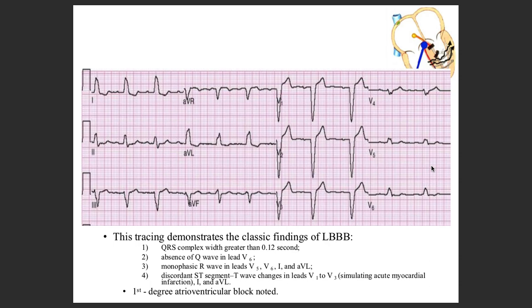Now what is happening in V4 to V6? Let's go through, for example, V5, V6. QRS is positive or negative? Positive, right? And what is the T wave? Yeah, I can agree. V5 is more of a positive. V6 is not really positive. It's more like a bifid. Okay? Isn't it?